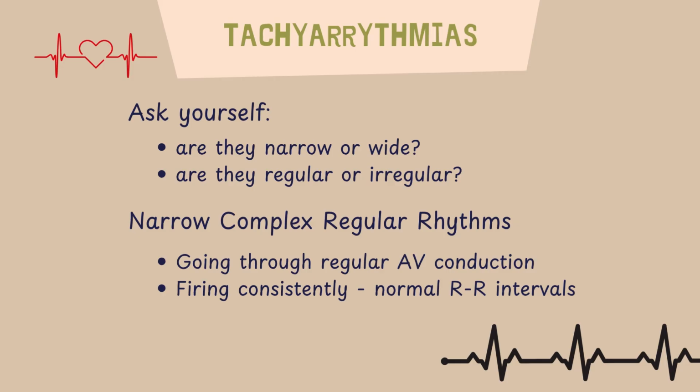Alrighty, we get to arrhythmias. Let's jump from sinus tachycardia into tachyarrhythmias. With tachyarrhythmias, the smartest thing to do is divide them. We have to think about, are they narrow or wide? And are they regular or irregular? Let's tackle the narrow and regular first because those are really cool and I really like them.